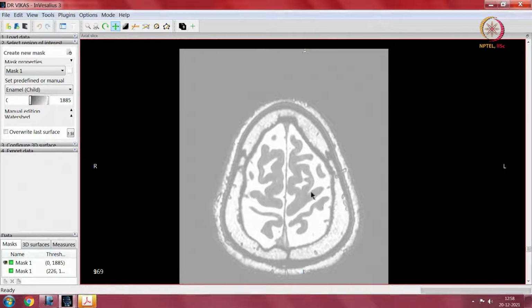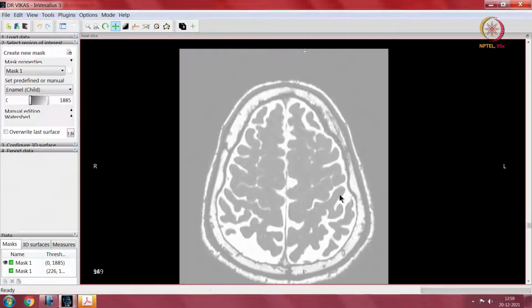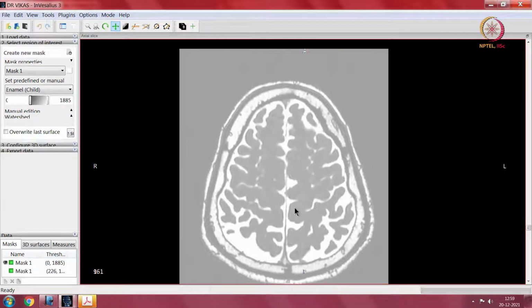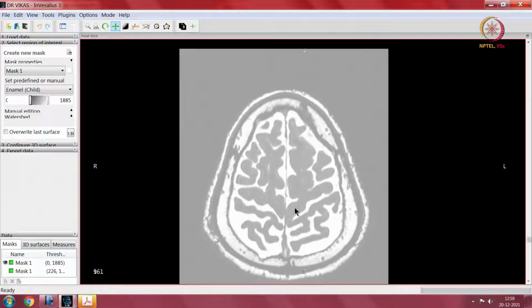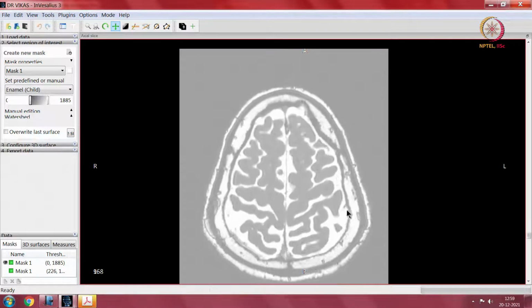We also know that the motor cortex, which is anterior to it, in front of it, is thicker than the sensory cortex, which is behind it, and that is another landmark. As I showed you, you have to be careful in your delineation, because if you look at this section which is slightly lower down, you would find that the central sulcus over here is not ending up to the midline. It is a 3D structure, so you should make your inferences very carefully and then identify.